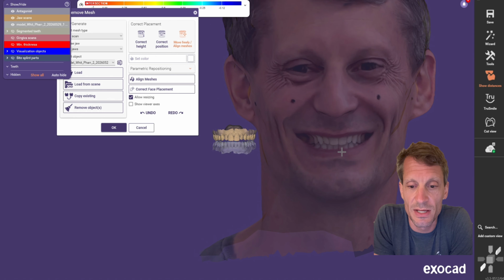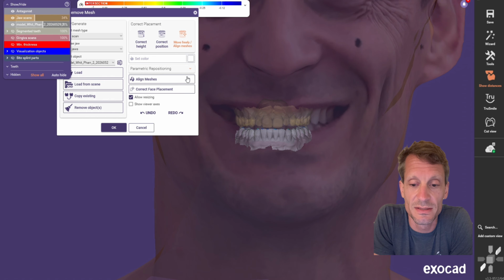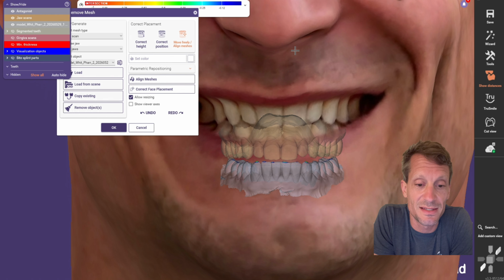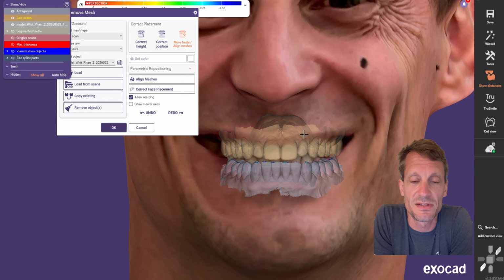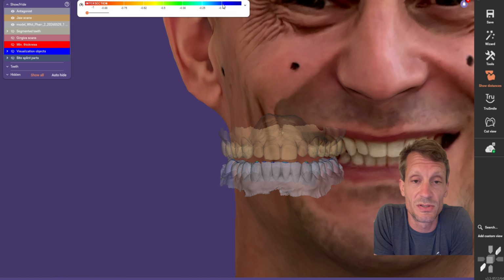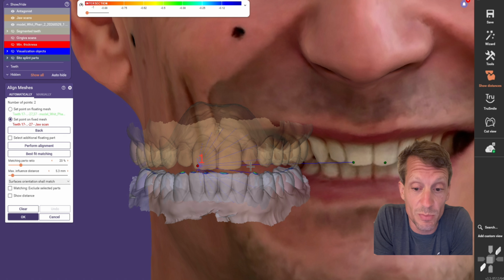So first, this is obviously myself, right? I'm just getting the teeth lined up, and I'm scaling the size. You can see I clicked on allow resizing, so the size is going to be very similar. It allows this overlay to be extremely close. So when I match things, it's not 3-point matching, I'm actually going to do a 10-point matching. I'm picking 10 points.